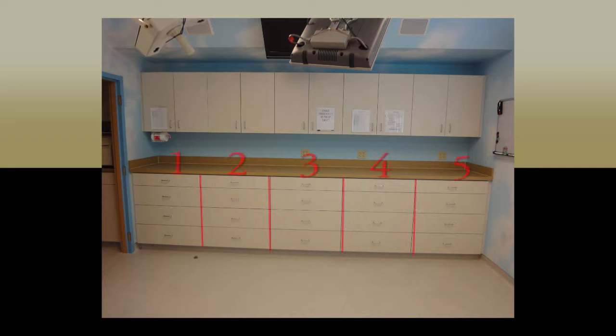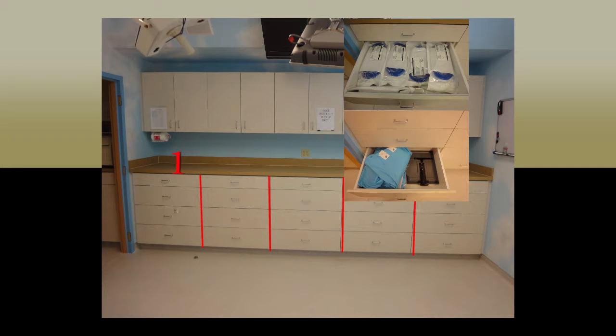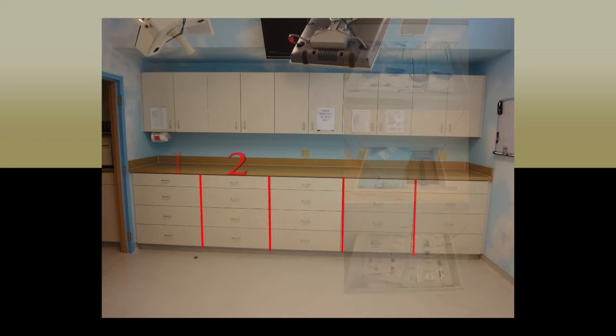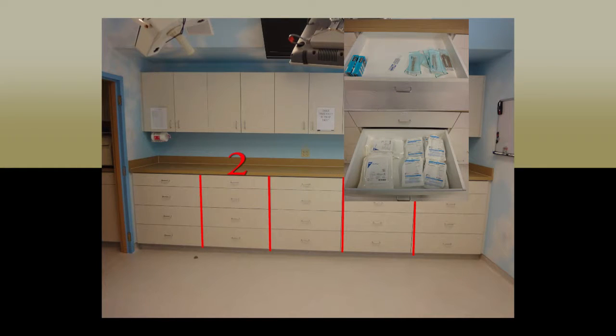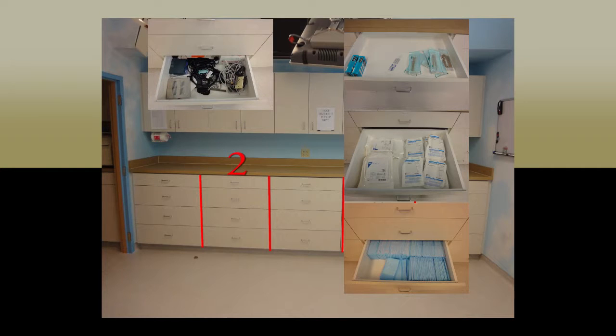There are 5 columns of drawers, beginning left to right. The first column houses the arthroscopy tubing, demonstration extremity packs, and ice pads, to be used with the ice machines post-operatively. Column 2 contains sterile Q-tips, sterile sleeves for the Fluoroscan or C-arm, extra large chucks to place on the floor during each case, and the bottom drawer contains miscellaneous extra power cords for the equipment.